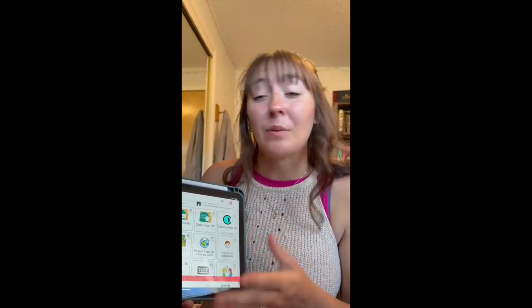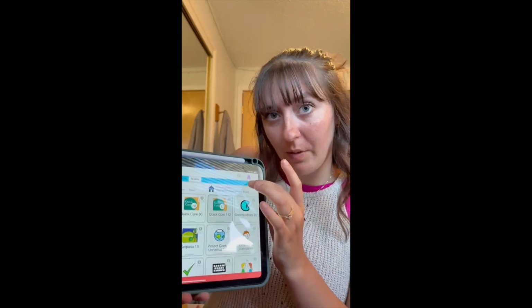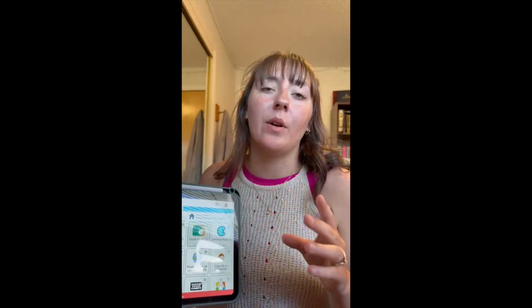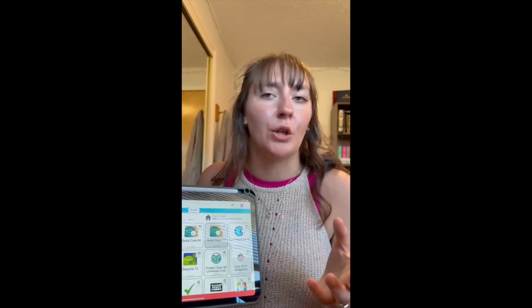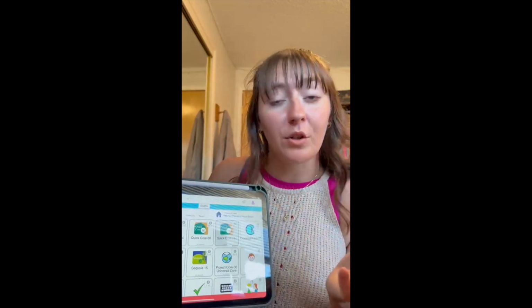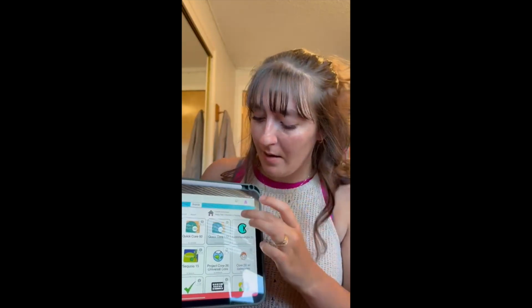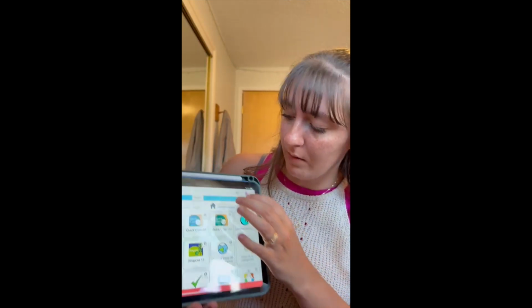And so what's really nice about CoughDrop is that it does have a help me choose a home board section right up here. So that just means that this is going to be your default board. Doesn't mean that you can't still alternate between boards if you choose to. So I'm going to show you how to kind of go through that today. So if we go to help me choose a board.